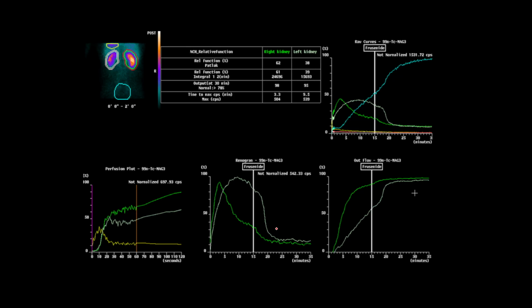So how do we calculate that? Well, we usually take it from the point at which the patient started to respond to the diuretic. So the diuretic was given here, and the patient started to respond straight away. Now, I'm afraid these are not going to be very good pictures, but what we do is we want to draw some sort of a line here.